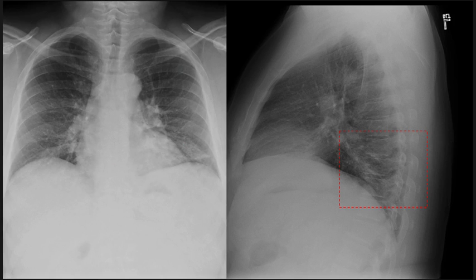So taking a look at this same patient now with the frontal view, we can see that there's some airspace opacity there. So this was indeed a left lower lobe pneumonia, pretty subtle looking at the lateral view, unless you consciously think to yourself, man, I want that spine to get darker. And if it stays the same, then that's positive.